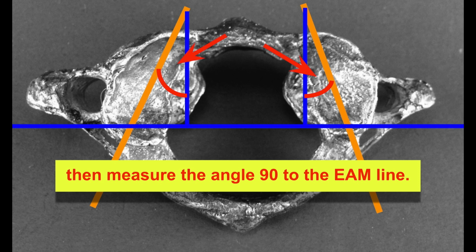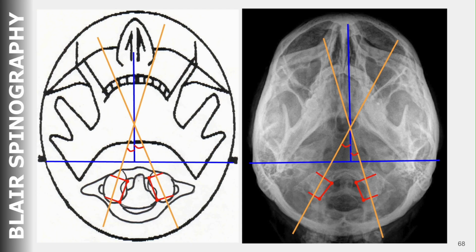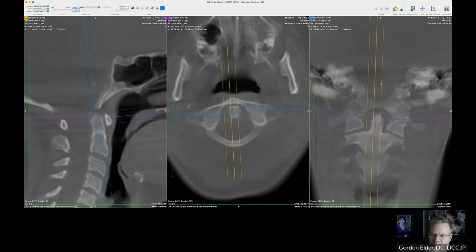I found a couple of things. Number one, because we can move things around a little bit once we get the protractor view, these angles, plus the angles for the adjustments when we're doing the adjustments, are getting us generally into the right area. I tend to feel, and this is not the official opinion of the Blair Society, that we can fudge these a little bit.